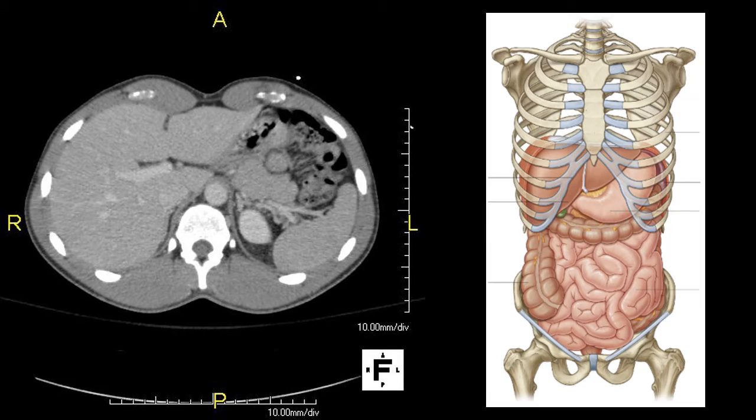I'll use this image to point out generally where we are in the abdomen first, but since the structure we want to identify is located on the posterior abdominal wall, you can't see it on this picture, so I'll show you a better picture next slide that will identify our structure. Before we do that, we are about here in the abdomen, and I'll draw a black line right now.